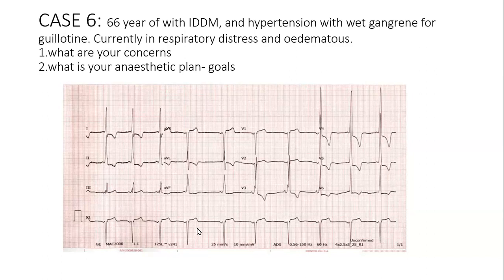Tell me. With this history, what else do you think is going on? Kakamba is correct, so there's left ventricular hypertrophy. What else? Look at your ST. I think the patient could be having an anterolateral STEMI. Well, taking into account the history of diabetes, such patients may have a silent MI. I'm not sure.